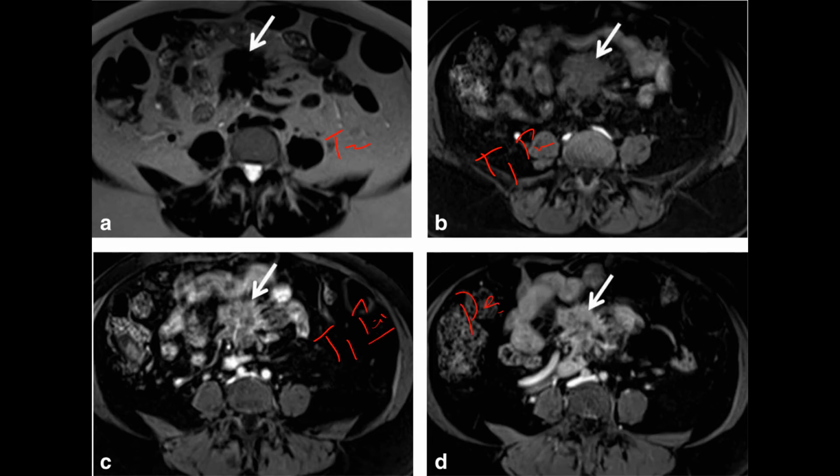So we are given a T2 weighted image in which the lesion is appearing very dark, okay, very dark on T2. That means this is one of the lesions which appear dark, and it is showing enhancement in arterial and delayed phase. That means it's a solid tumor. Now it is a solid lesion which is hypo on T2. That means that it is a highly fibrous tumor.